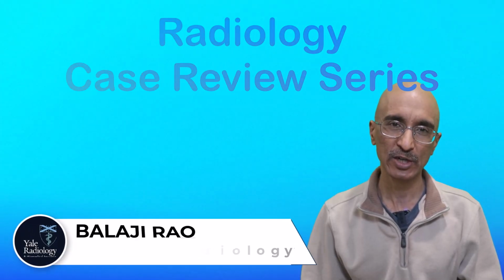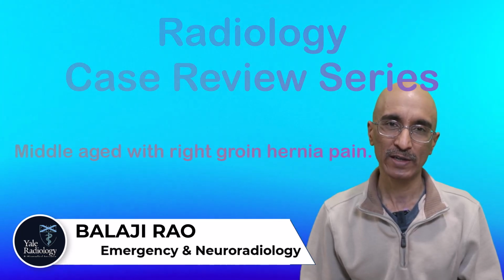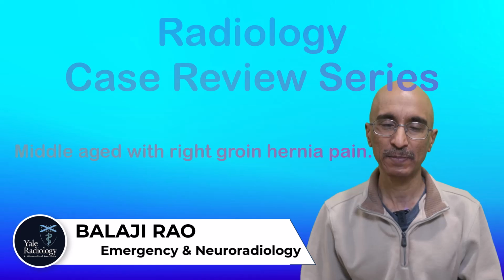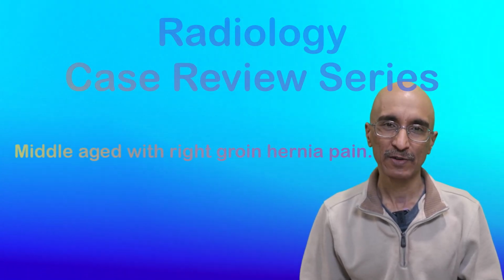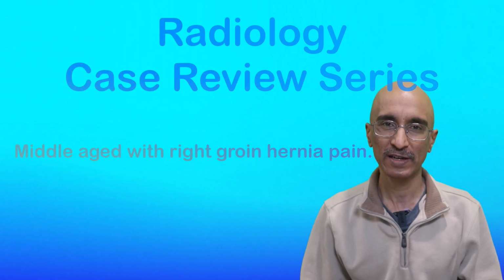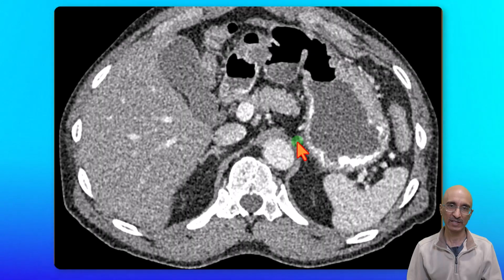In this video, we are going to look at images of a middle-aged patient who had a history of right groin hernia. He presented to the emergency department with irreducible hernia and increasing pain. He was referred to CT examination for further characterization. CT examination was performed following administration of intravenous and oral contrast.